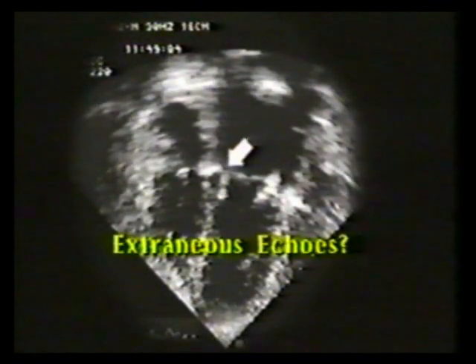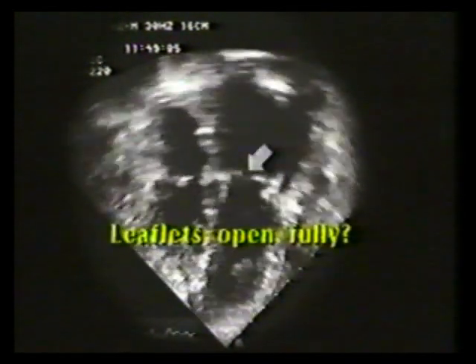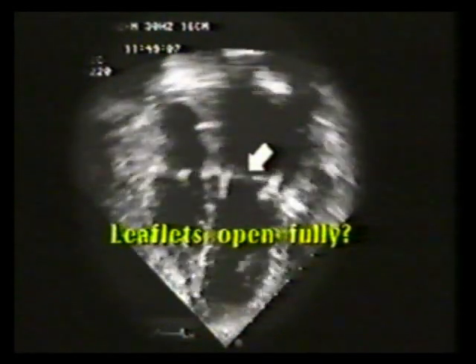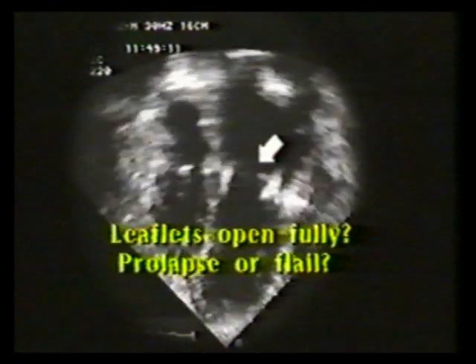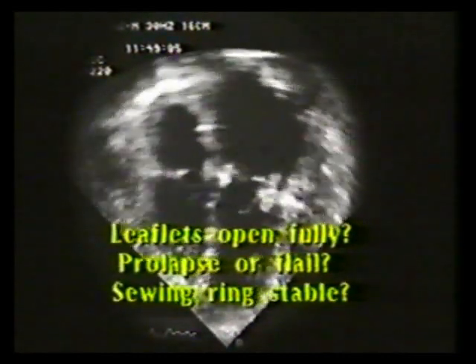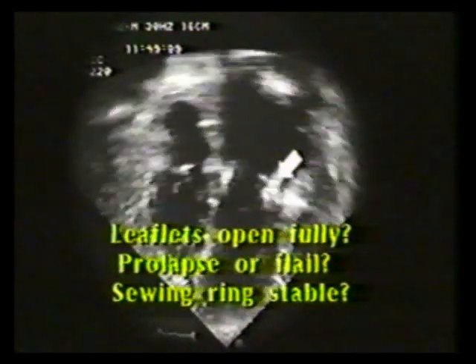Are there any extraneous echoes that might represent vegetations or thrombus? Are the leaflets normal in thickness? Do the leaflets open fully? Is there any prolapse or flail motion beyond the sewing ring? Is the sewing ring stable, or is it separated from the annulus and rocking?